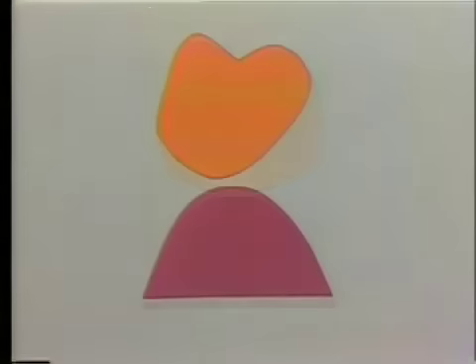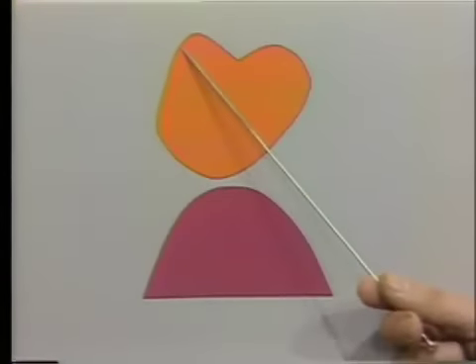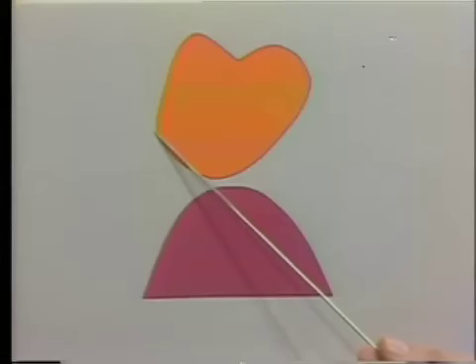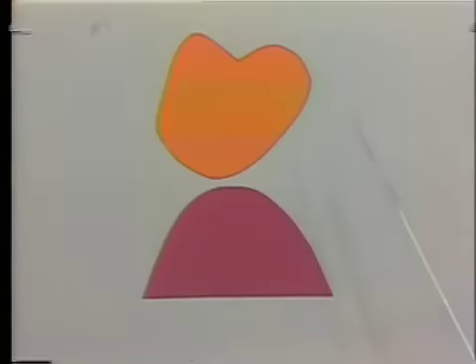in which the Pontic form has been developed as is shown here. I think you can recognize that on the buccal surface here, the occlusal 2/3 are left more or less the same as the natural tooth. And then the surface swings in to a point here just opposite to the crest of the alveolus.